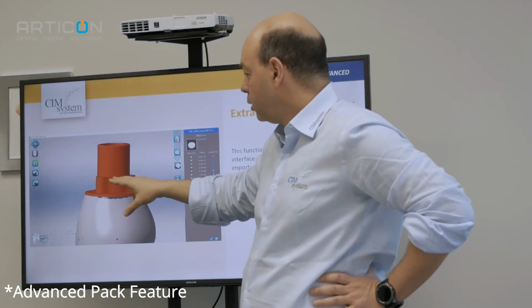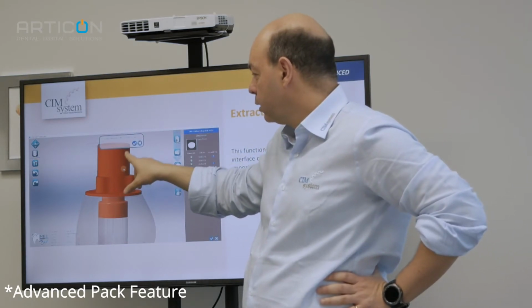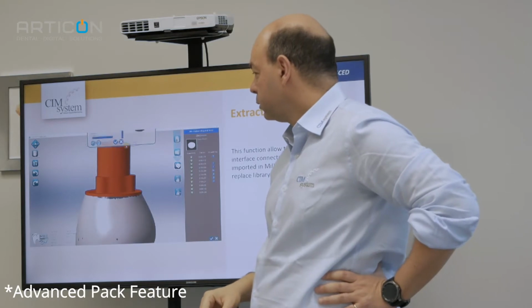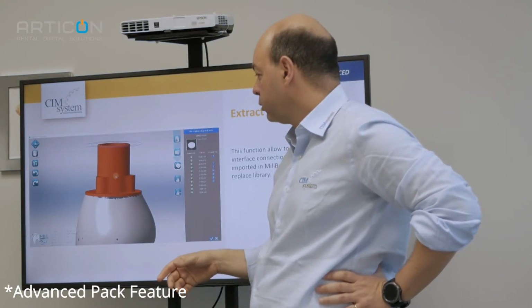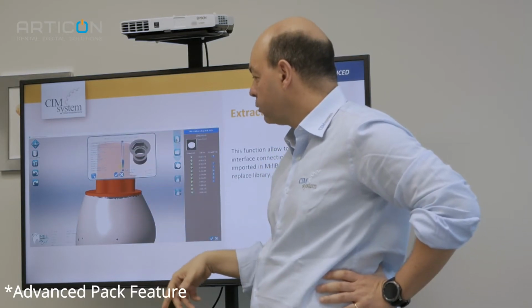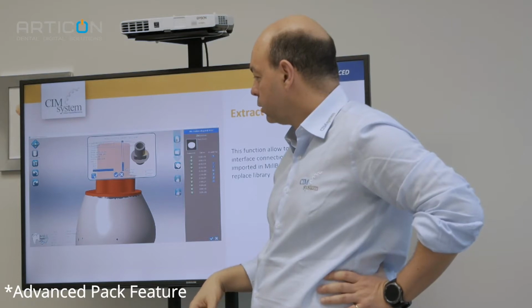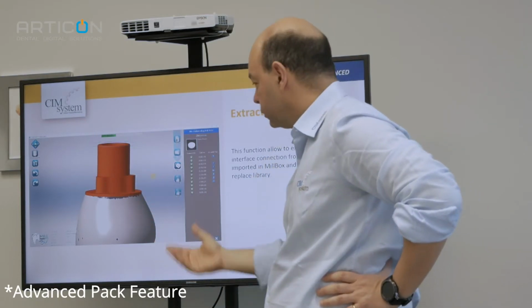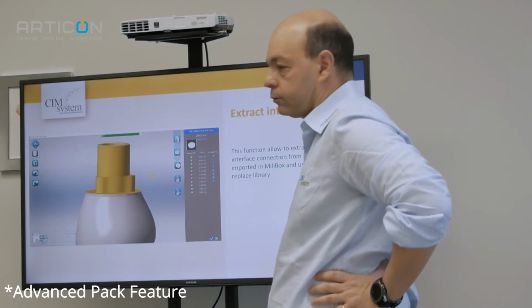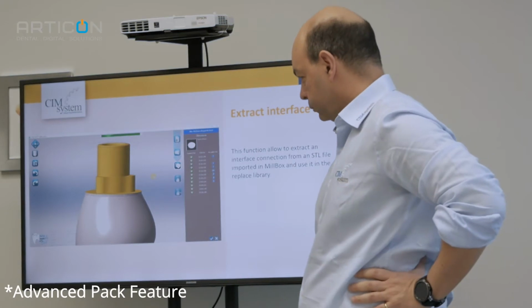Okay. After, it's possible to use the replace function. I click here. I confirm. I select this unspecific code, and now if I go down, I have the test 3. Okay, of course now it's easy because it's the same, but this is a very good function.